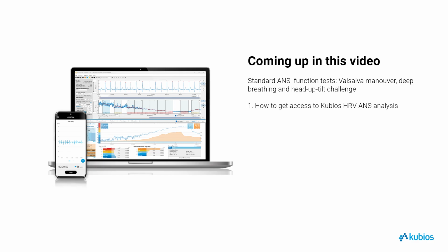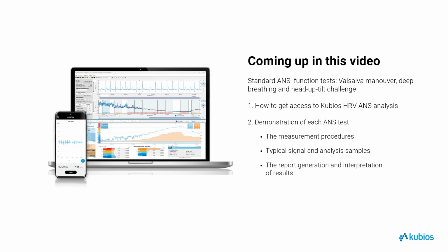First, we'll cover how to access the analysis tools within Kubios and the prerequisites for performing these tests. Then, we'll examine each test systematically. We'll demonstrate the measurement procedures, typical signal and analysis samples, and finally, the report generation and interpretation of results.